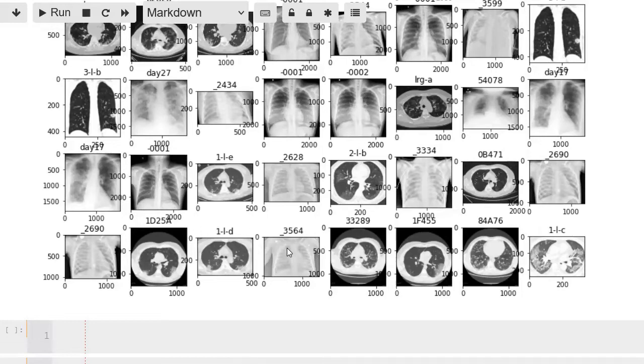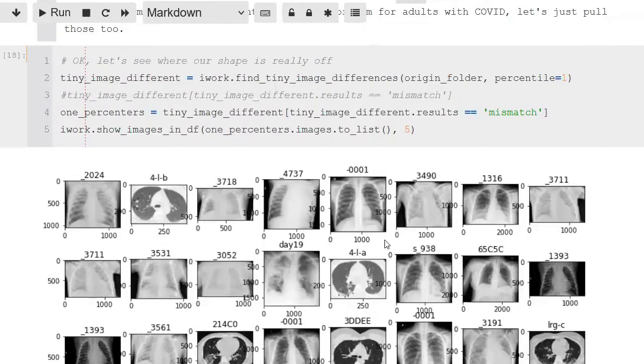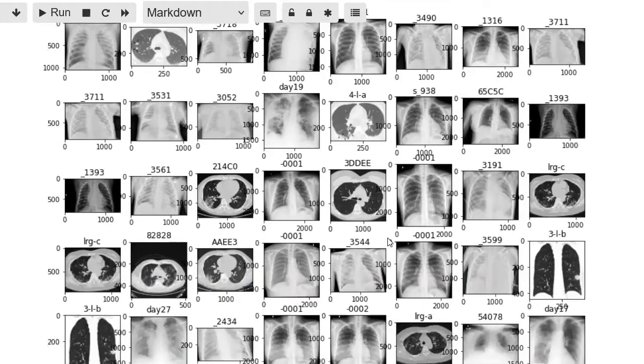cleanX has many other functions, including ones that allow you to find images with text, and ones that allow you to compare images in different ways. But this notebook is just an example of how you can use some very simple functions in cleanX while you take a coffee break to try and find images that you would want to pull out of a data set.